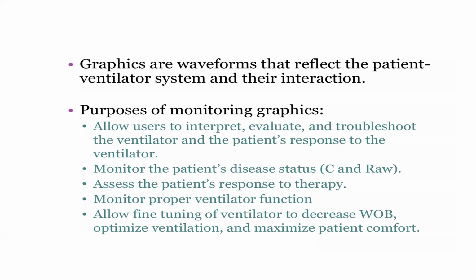The purpose of monitoring graphics is that it allows the user to interpret, evaluate and troubleshoot the ventilator and the patient's response to the ventilator. So, monitor the patient's disease status and assess the patient's response to the therapy. It monitors proper ventilator function. It allows fine tuning of the ventilator to decrease work of breathing, optimize ventilation, and maximize patient comfort.